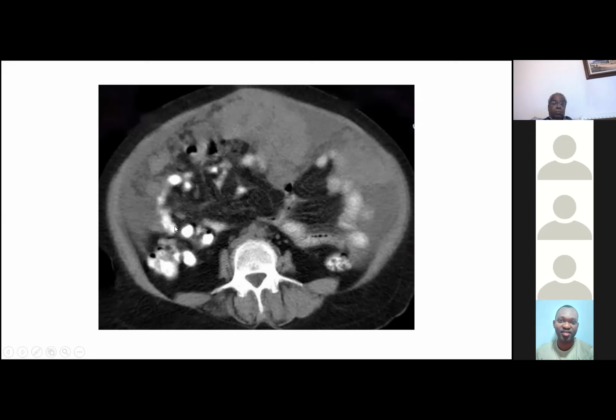So we then proceeded to perform a CT scan of the abdomen and pelvis. Now, this examination here was done following oral contrast. You can see where the arrow is. You've got this dense area. What we used to do in the past was give patients X-ray dye to drink, and that showed us where the bowel was. These days, we don't tend to do that. Patients just come off, they don't get given anything to drink in the acute setting. They just have the scan straight.